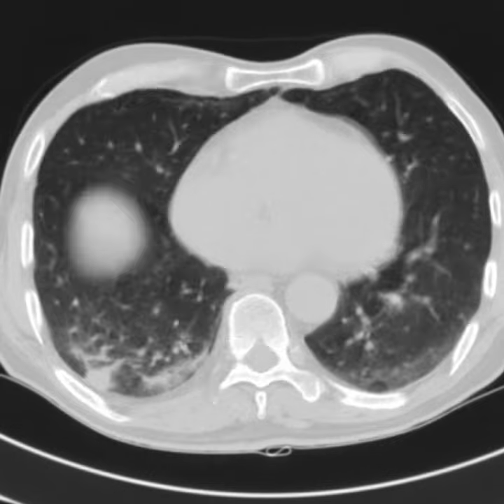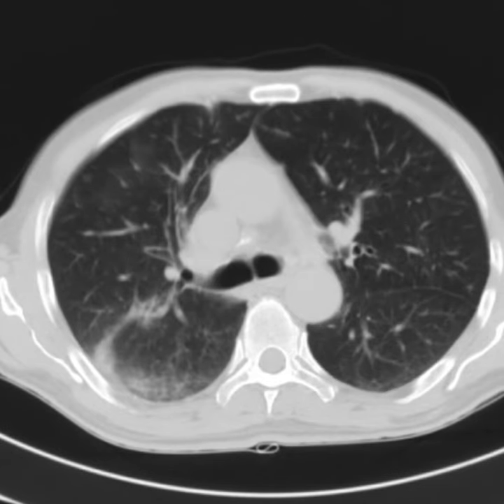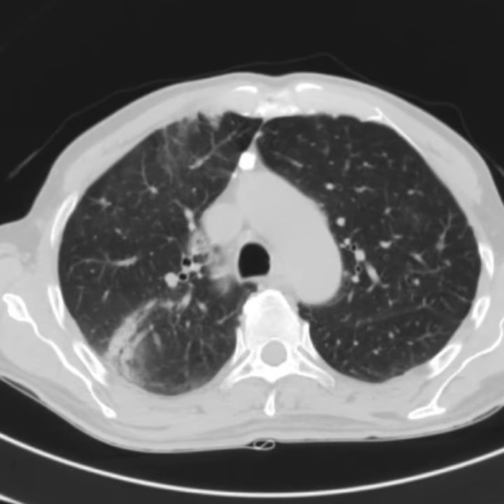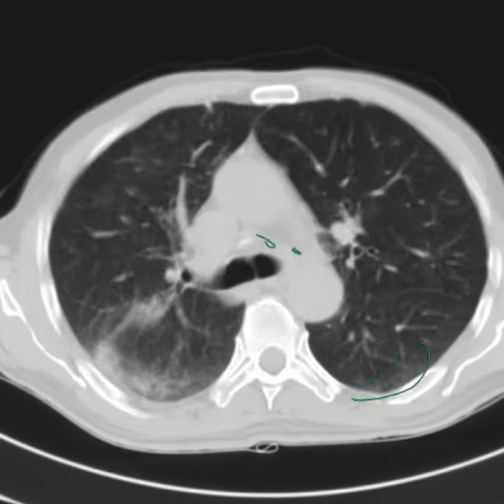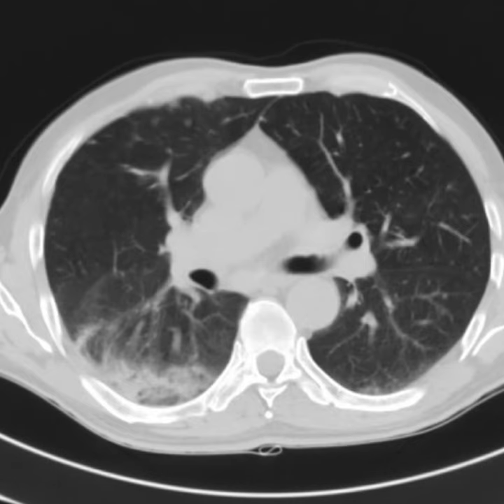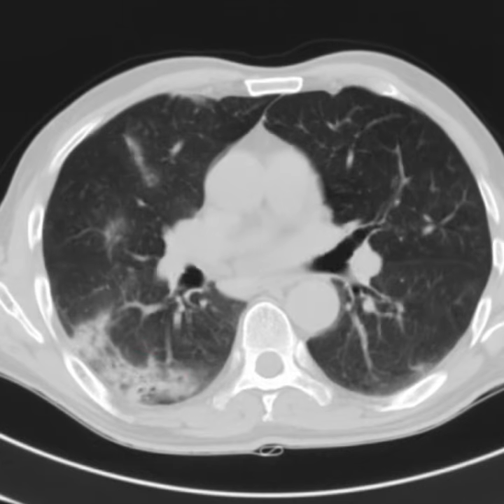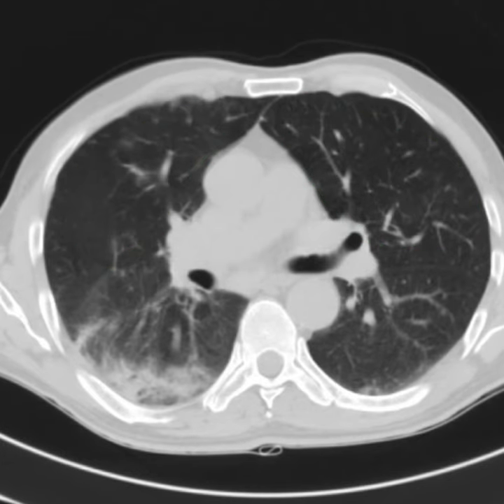Well, considering bilateral asymmetrical distribution of areas of patchy ground glass opacity, I would think of a differential diagnosis, for example, atypical pneumonia. Viral pneumonia is a good candidate. Good job. What else?